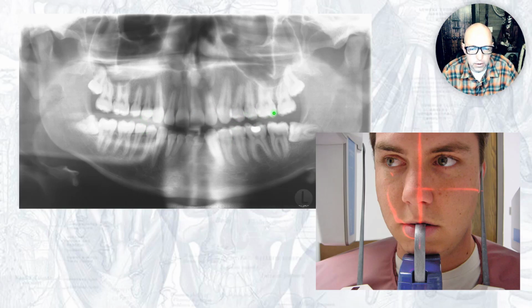These ones look nice and open. But which teeth look larger, the left or right side? Left side, those look stretched out. They look larger. The right side looks narrower. And so you can tell there's rotation.